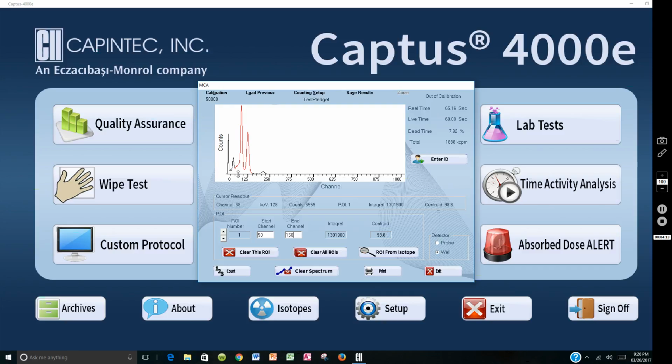You can use this MCA for thyroid uptakes, for pledget counting, anything you want to count, unknown activities, etc. You can always save your results to Excel. You can load previous settings, load previous counting setups, whatever you want to load up here. And then you want to always give it an ID, which would show up in this part. This kind of covers the setup for the MCA counting, a very simple setup for doing counts either on the probe or the well.